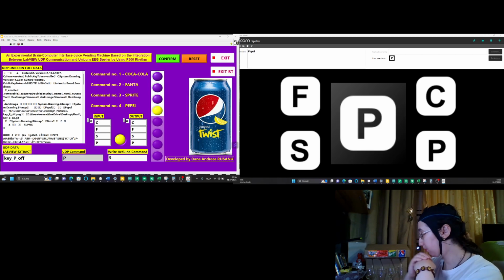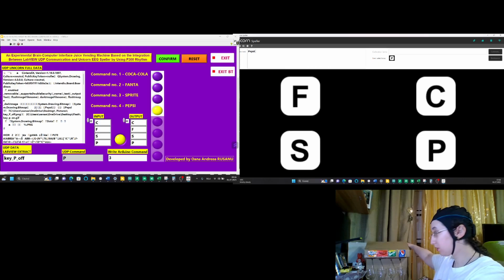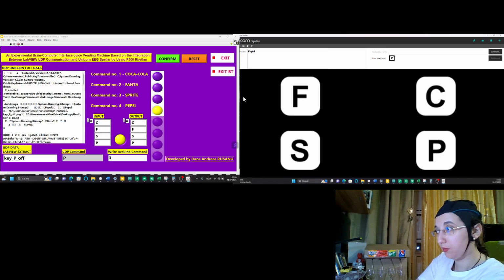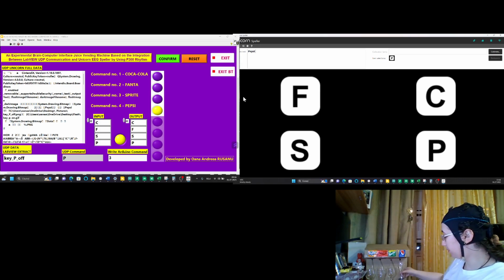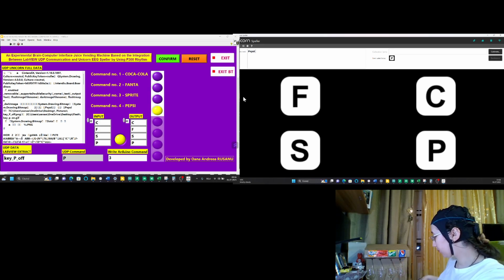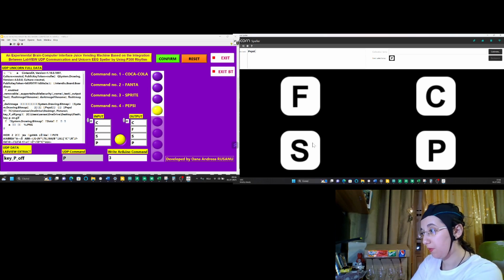Okay, so Pepsi is now, let's see. Okay. I want to stop it. So here Pepsi was already delivered. I should arrange this tube. Okay, next. I want to choose Sprite, so I will focus my attention to S.